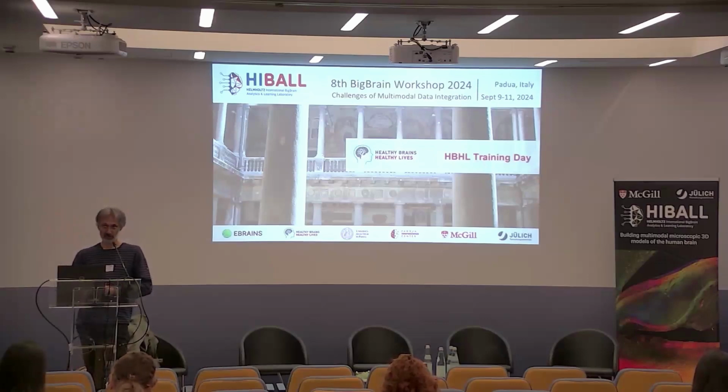And for the second question, when you have a stroke, the segmentation tools actually don't perform so well. It's possible to provide a mask of the lesion in the Morphologist segmentation pipeline.